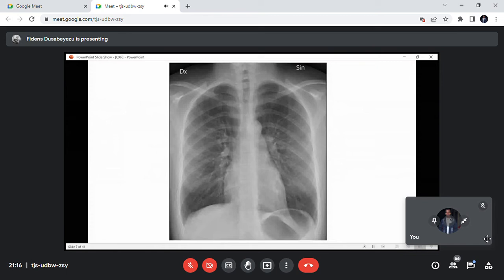After the mediastinum and passing the hilum, we go to the lungs now, the reason why in most of the cases we have done the X-ray. So the lungs: there is a right lung, a left lung. You know that the right lung normally has 3 lobes, and the left one has 2.